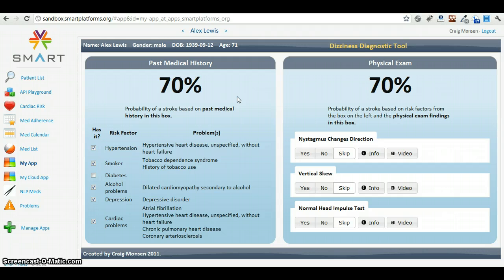Providers can review what diagnoses from the patient's problem list have been selected and adjust them accordingly. For example, if a provider decides here that this patient's previous smoking problem and depression are not really active issues, he can unselect those parts of the history.